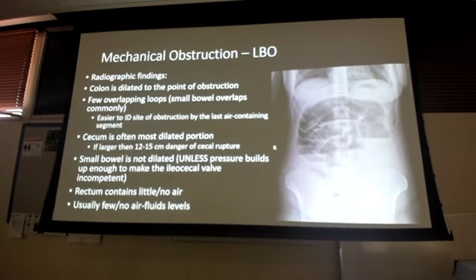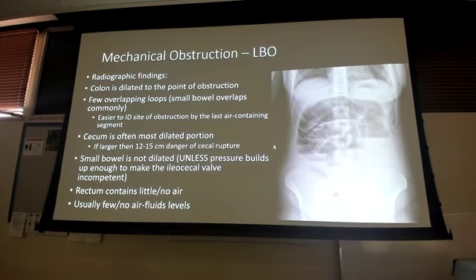So, what do I have here? I have a large bowel obstruction. And remember how I said, X-rays, if they're upright, are going to tell you what on the film? Well, right. But what? And how do you know whether or not an X-ray is upright or not? Correct. It's going to say erect or upright or something like that. Does that say that on this film?